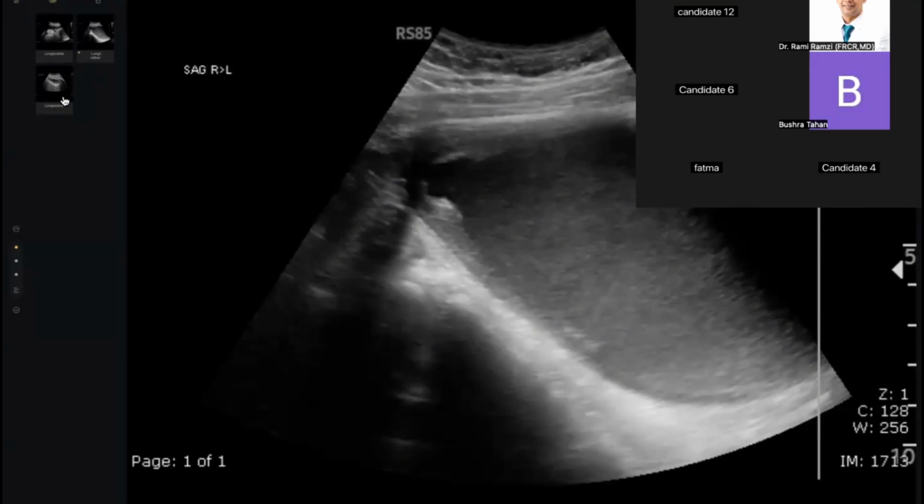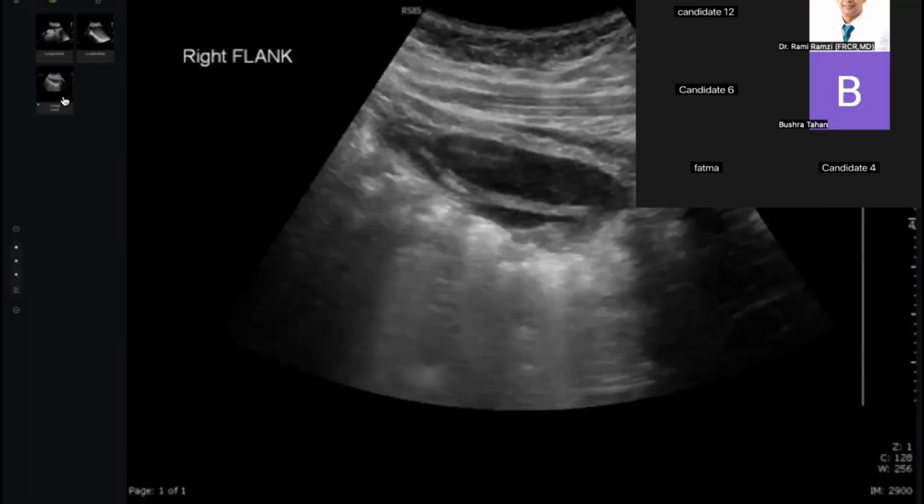Looking at the second image, I can see a well circumscribed region in the pelvis. It is relatively homogeneous and uniform with some internal debris and a bit of posterior acoustic enhancement. I'm thinking this would be in keeping with the bladder, but I'm not sure as to the exact side. Can I look at the last image as well? I see that there are three images.